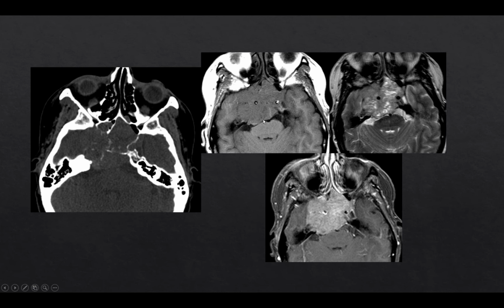central skull base, the clivus, which is relatively low in intensity on T1 weighted imaging, heterogeneous in attenuation and heterogeneous in signal on the T2 weighted sequence, and demonstrates fairly homogeneous post-contrast enhancement with mass effect on the pons and midbrain. We also want to describe the encasement of the carotid arteries. We can question ourselves as to whether these are formation of a chondroid matrix or formation of some other bone elements, but the picture is not perfect for that.